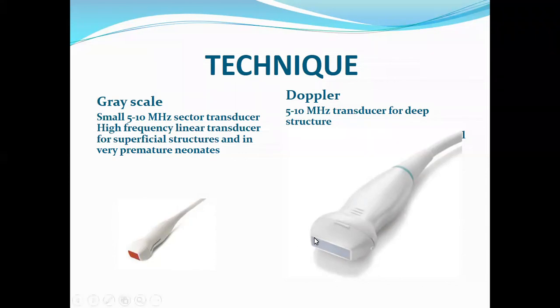The other transducer we use is a linear transducer. This transducer is a high frequency transducer, usually 5 to 10 megahertz, and it's very high in resolution. So you'd want to use these transducers as you employ your techniques.